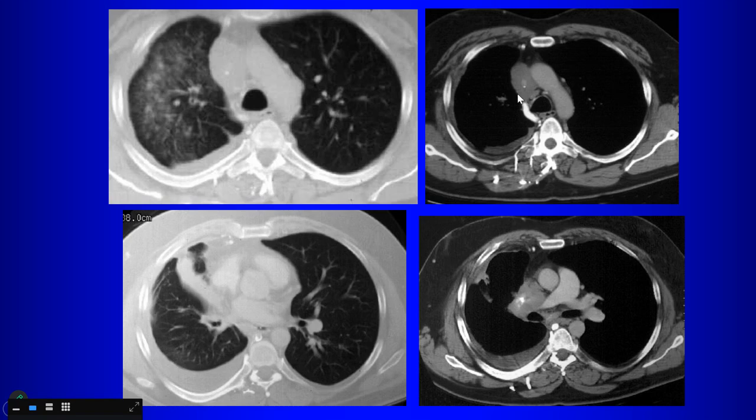Well, there's a mediastinal mass, right? And that mediastinal mass could be obstructing what? Yeah, pulmonary vein. What is this guy? Yeah, it's a dilated azygos filled with dense contrast, telling you that what's obstructed? Well, what is SVC. Yeah, the SVC is obstructed. You don't see it there. Okay, so this patient has a mediastinal process obstructing veins.